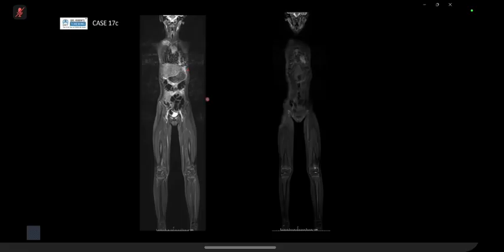Nowadays, with whole body MR, people use it to see if there are any other sites of asymptomatic disease, and often you're thinking of the knees and ankles. It's one of those sites, and then you're looking for metaphyseal involvement, but often they can cross the physis and involve the epiphysis as well, as in this case. So this was discussed at the bone tumor unit, and given the MR findings, this was more likely to be CRMO.